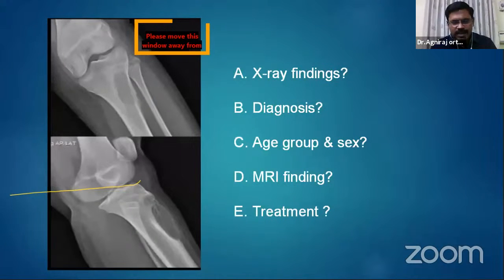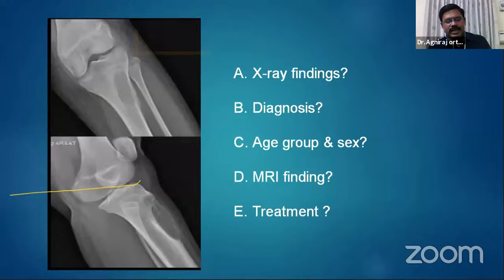So actually, this is a repeat X-ray. This is not a new X-ray. This X-ray was taken from the first class of TNOA PG teaching. Professor Devadas sir put this X-ray. I asked the same X-ray. This was the X-ray given for the DNB examination last year.